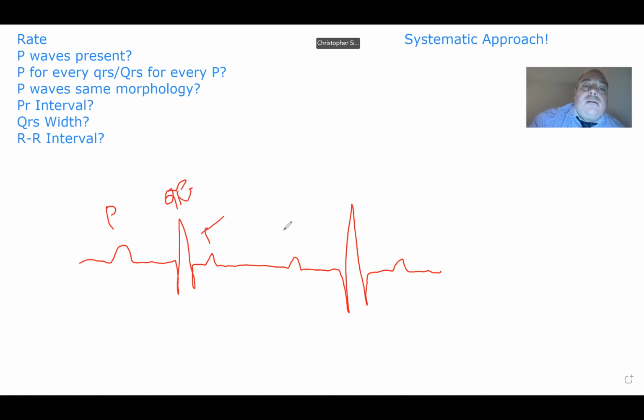We got a T, P, QRS, T, so on and so forth. Okay, so let's look at everything we got here. Let's just say, for the sake of argument, our rate is 80. Let's ask ourselves the questions.